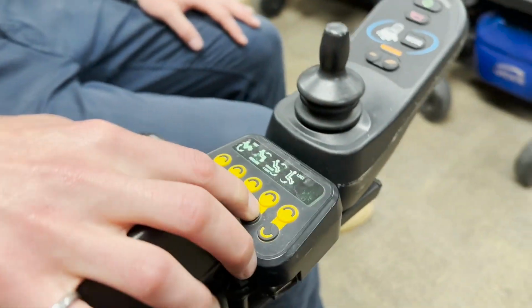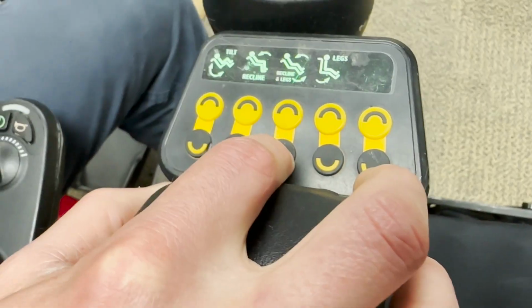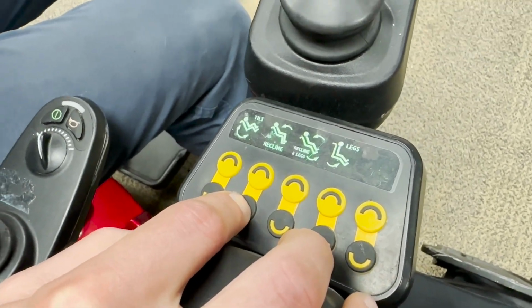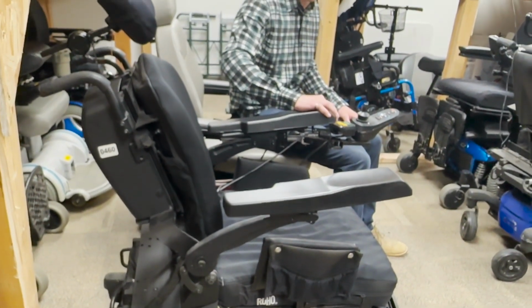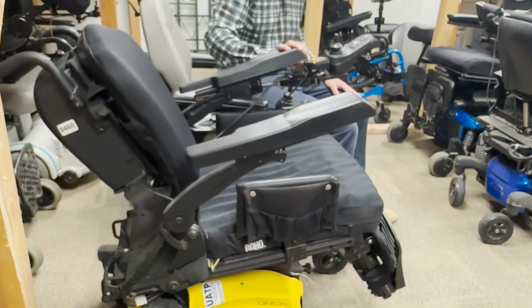Okay, so this is power elevating leg rest. This one does reclining of the seat back and the legs. And then we have recline, so this is just like a recliner in your house. Okay, we're reclining the seat back. We're able to bring it forward. All of those make sense from a comfort standpoint. This is the one though that might surprise a couple of you.